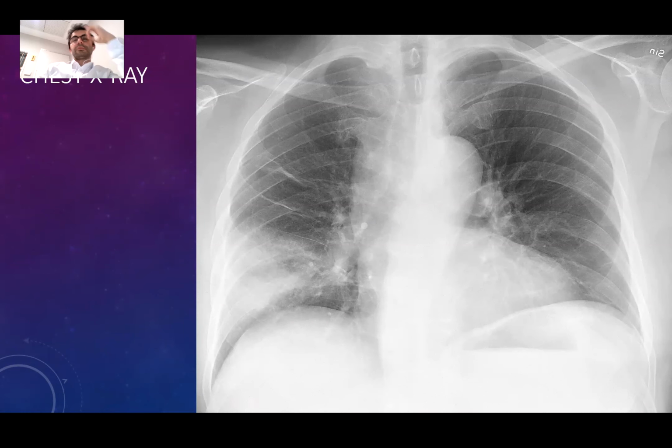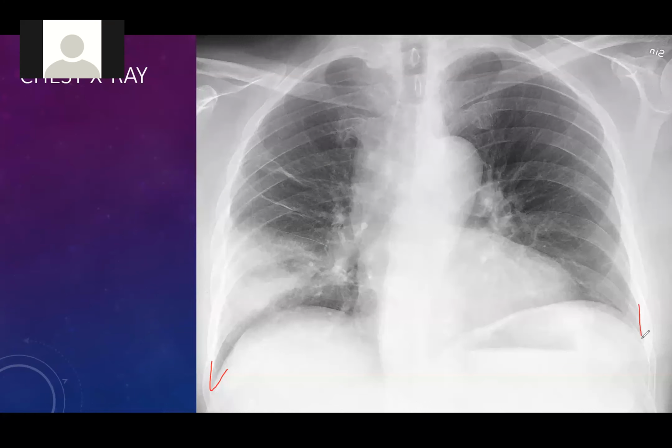Now move on. Now I'll look at the pleural lining. And you check the bones. All right. You check the pleural lining. I think it's normal too. Me too. And the costophrenic angles, they're both sharp. Good.